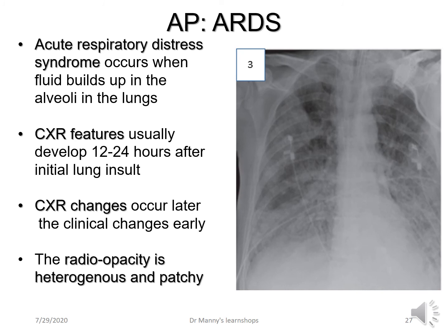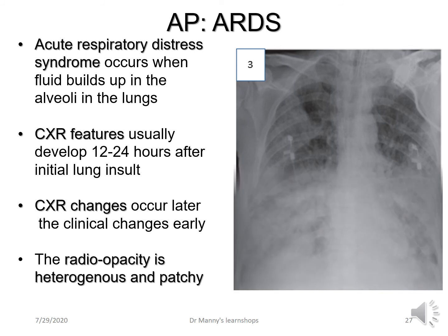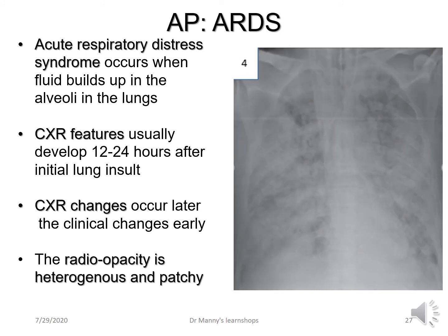The X-ray continues to get worse, so does the patient on physical assessment, until the end result is basically an X-ray that is really difficult to see any blackness at all or radiolucency, because the lungs are really full of fluid.